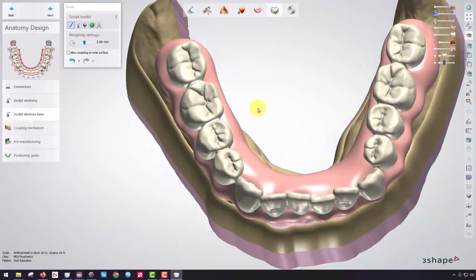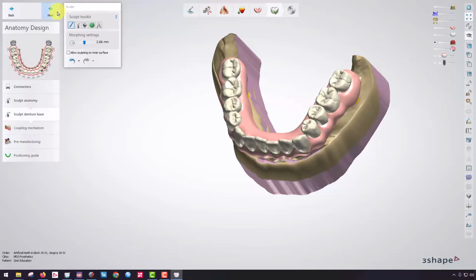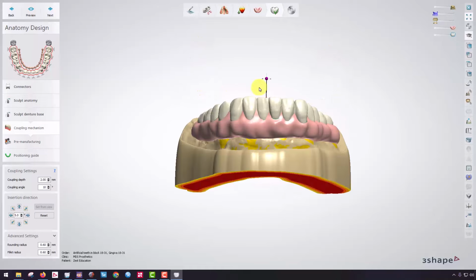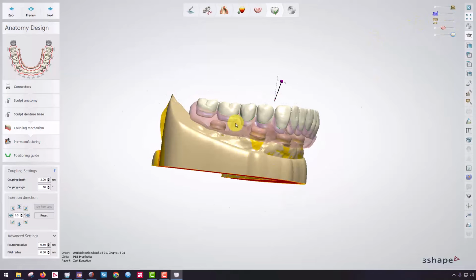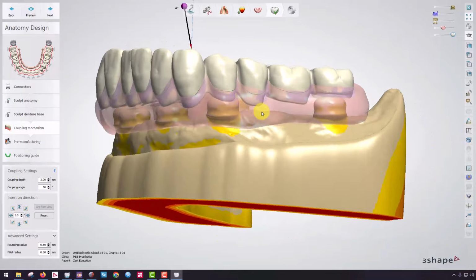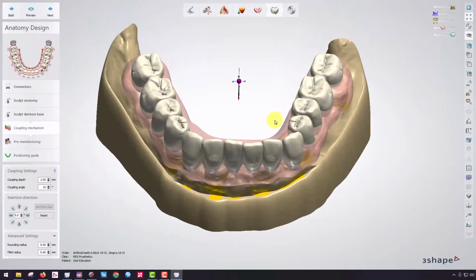All right. Now, for the most part, that prosthesis does look pretty good. I'm going to go ahead and hit the next button and see what the software says. Right, so it's accepted my gingival design, because what I've got right now is we're going to hide this underneath here. You see here I got my locator scan bodies underneath my gingival design component right in here, adding a little bit of thickness right in here just for the thickness of the prosthesis around that scan body.